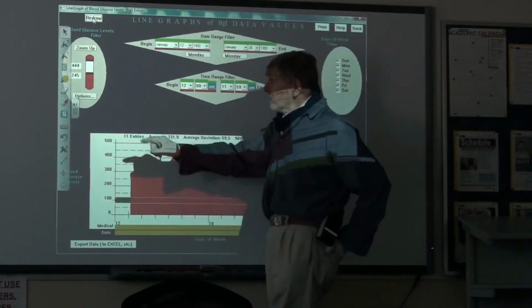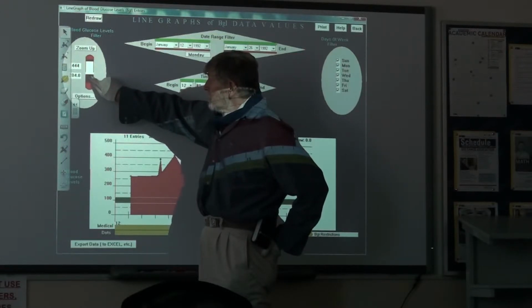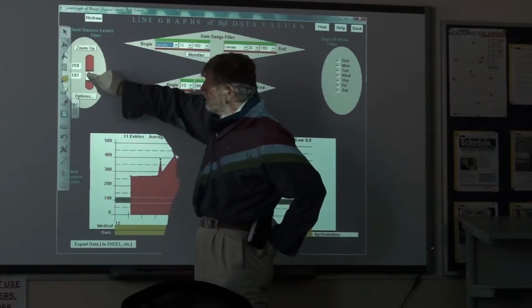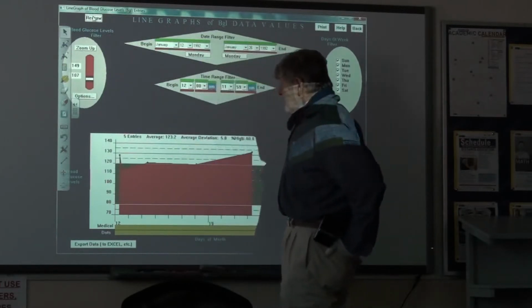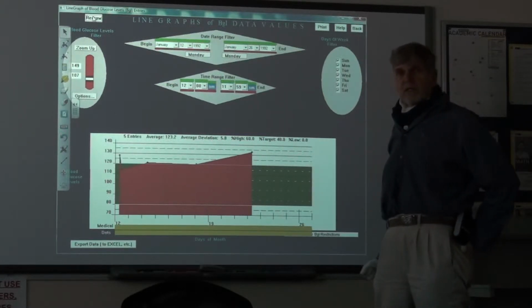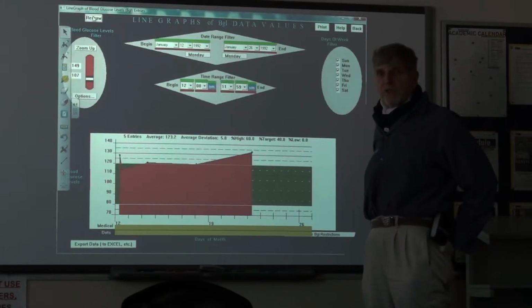Alternatively, you might want to look at just your good readings. So bring this down to, say, 87. Okay, bring it down a little bit more. Looking below it, we'll move it down by 10s. Okay, there's a nice 107. And bring this down to, say, 149. So those are what you want to see. Then these show you just the readings within that range of blood glucose readings. And as you see, the graph automatically scales up so that you have the maximum amount of clarity for the data that's to be presented on the graph.